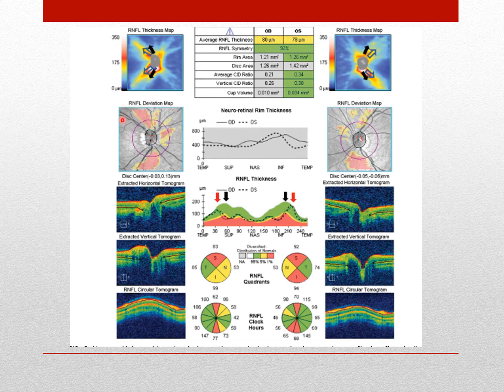There is nerve fiber, but it's just not in the area that it usually is compared to the general population. So the machine thinks that it's just thinning here, but we know that it's not true thinning. So that's why you have to really analyze everything here. The same can be true with the left eye, right? So here is the arcuate bundle, but with the general population it's usually in this area, but it's not, so it thinks that there is a loss there.